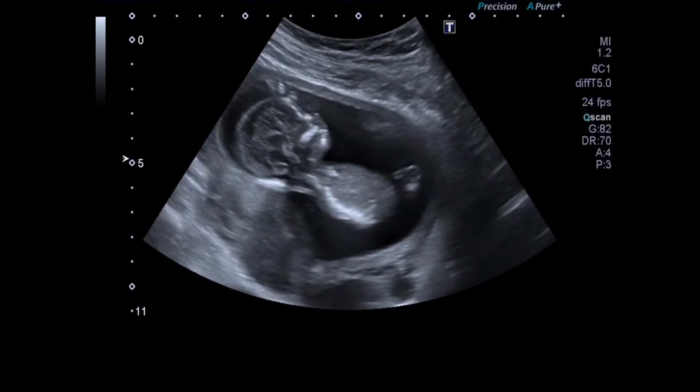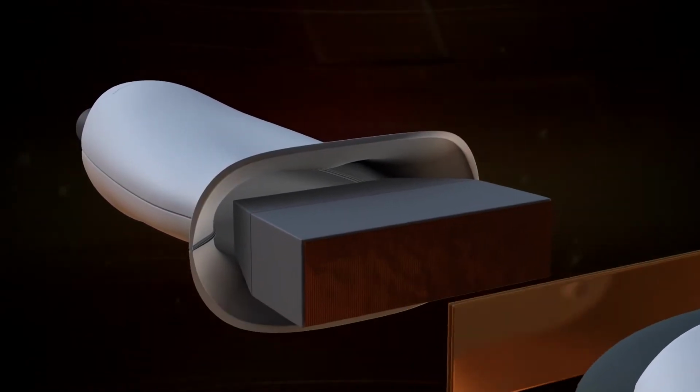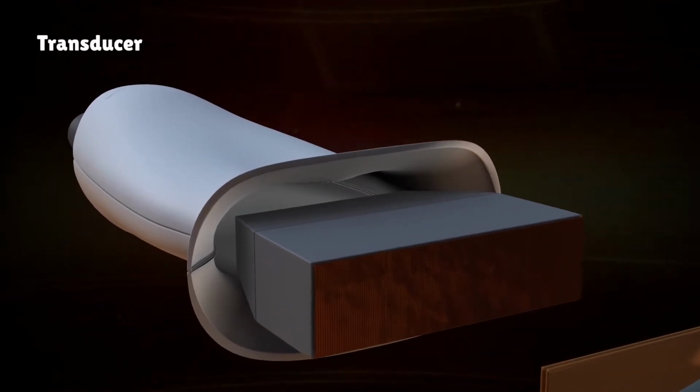Ultrasound has been a popular medical imaging technique for many years. Have you ever thought about how these machines work? In today's video we are going to see the 3D animation of how ultrasound works. So, let's get started.